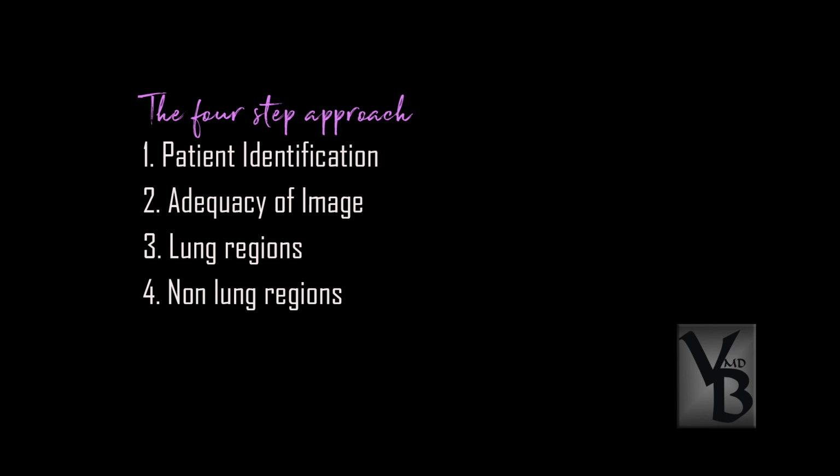Make sure you identify the patient right, ensure that it is an adequate quality image, look at abnormalities in the lung regions followed by the non-lung regions. A systematic approach like this would definitely enable you to pick up more abnormalities.